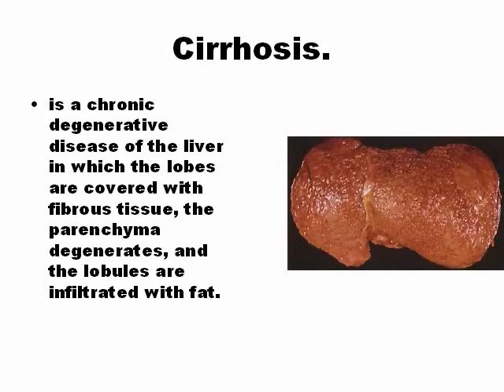Cirrhosis of the liver is the change of the normal cells of the liver, the hepatocytes, by fibrous cells, also called scar tissue. The liver, when there is cirrhosis, is no longer liver, it's only scar tissue, and this is the change that produces cirrhosis.